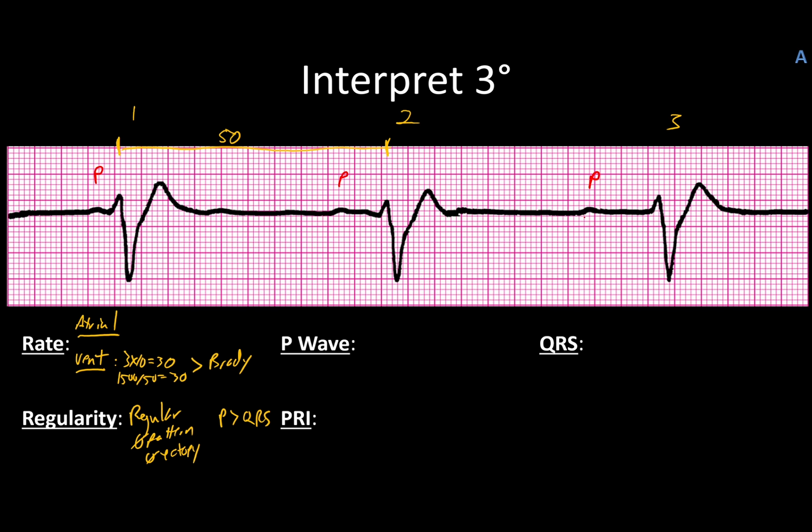If we measure out the PRI for those specific ones and figure out the distance and regularity, you'll see that this one here all the way across to here is a distance of 46, and that my PRI in that case is right around 4.